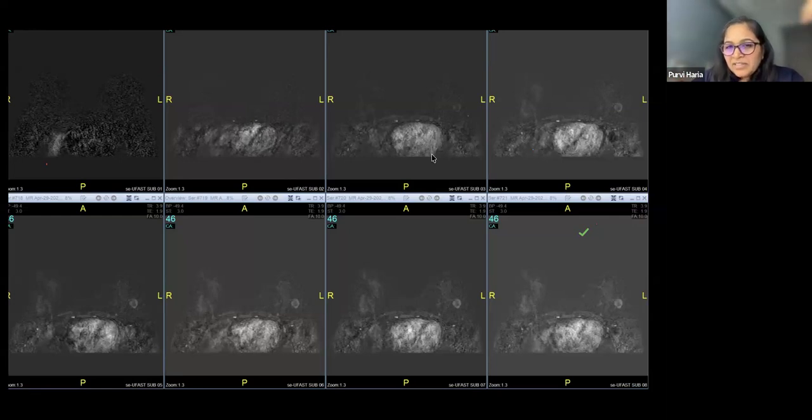Now here, this is the third phase. Here the heart is enhancing well. I do see some vessels in the axilla showing enhancement. Internal mammary vessels were seen before also, and there is something which has started coming in the breast.